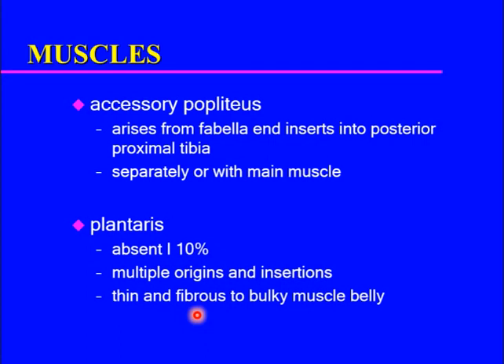Okay, these are the most important anatomical variants that we see in the knee joint. I hope it was beneficial. Now we know most of them. I'm sure when you see a knee MRI, you will find some of these variants and you will remember, this we know about now. It might look like a pathology, but it's not. Sometimes it might cause symptoms even though it's a normal variant, so you should report it at least.